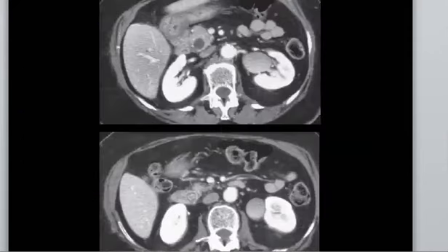Okay. So what do you think about this one? Where is the pathology? Distal common bile duct stone. Okay, nice. The annular pancreas is a bit different. You imagine it when you find another tissue of pancreas here. So it is a filling defect, it is a stone, choledocholithiasis.